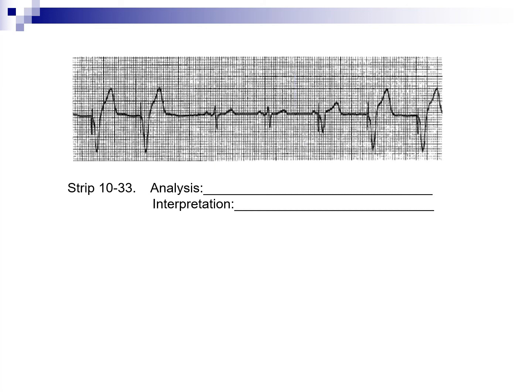So if you're checking sensing, you're going to see what the pacer rate is. When you measure from the patient's own beat to when the pacer came in, this would match the pacer rate. If this wasn't sensing appropriately, it would probably have come in too close to the patient's own beat, but for the most part, it did sense, it came in on time, and it's a normal functioning pacer.